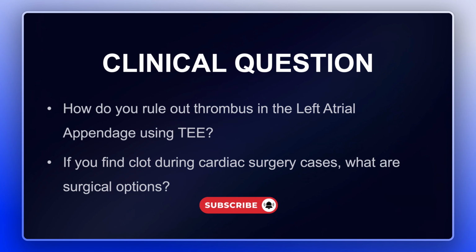The clinical question today is, how do you rule out thrombus in the left atrial appendage using TEE? And if you find this thrombus during cardiac surgery cases, what are your surgical options?